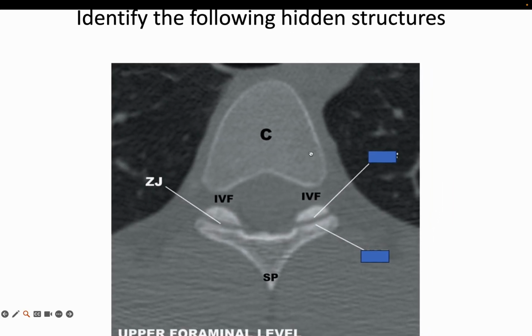So, in this axial image, we know this is the facet joint and this is horizontally oriented. This is the thoracic facet joint. So, between both of these, in this more anterior structure, is it the superior facet or is it the inferior facet?